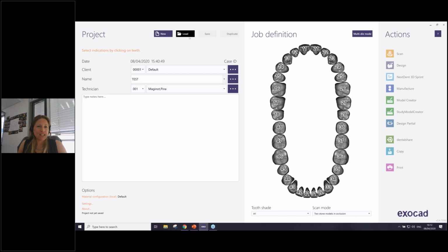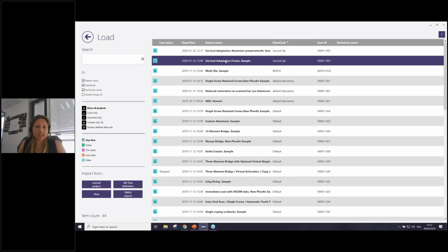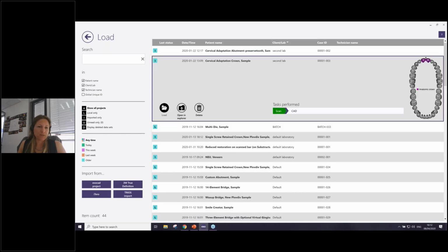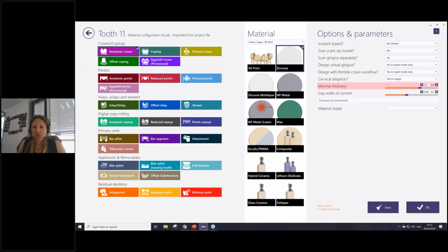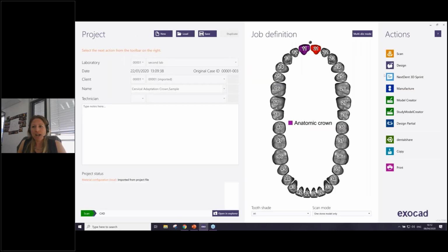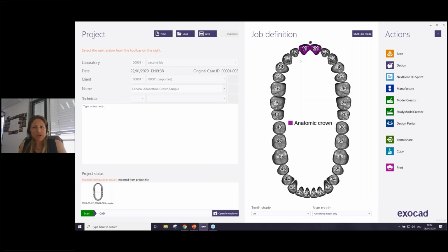So over here, I will load at first our small case with the 2 anterior crowns. One important note, here I have chosen pull to margin. And on the second one, I will choose the new function, preserve tooth library shape. One important note also, we have realized that not everyone knows all the key features on our keyboard.